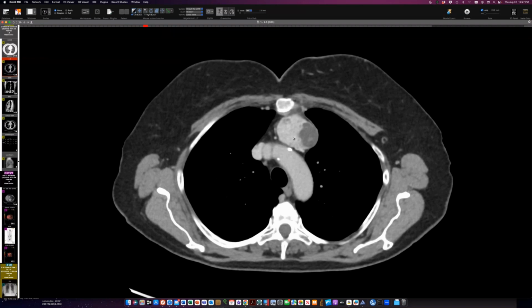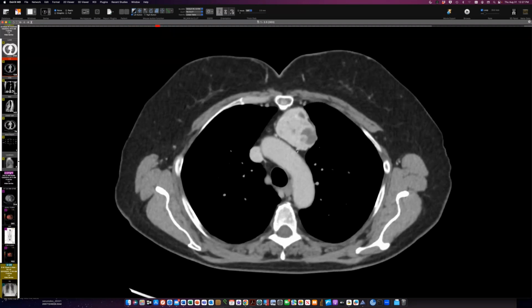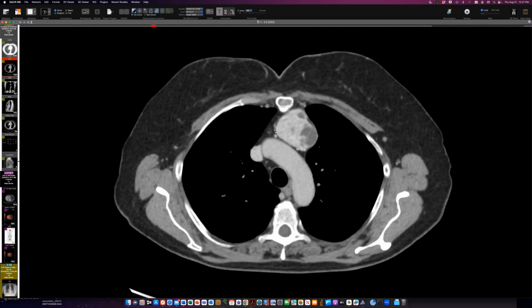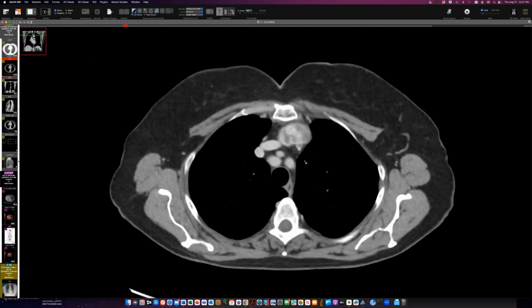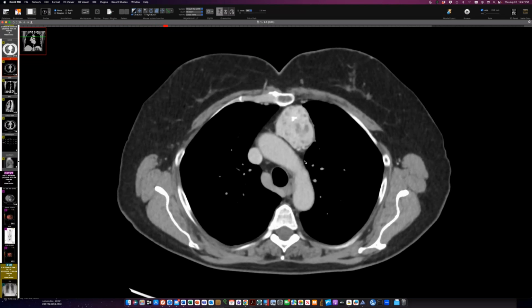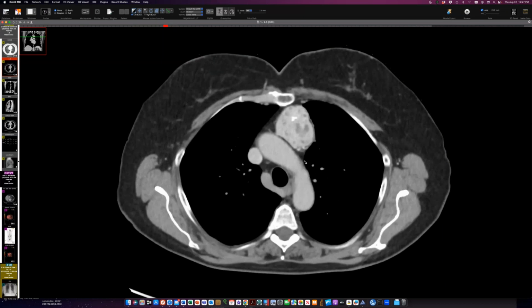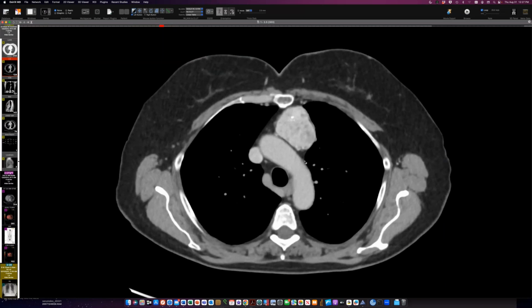And I think that the fact that it's vascular tissue is why we do see some hefty arteries. The paragangliomas I've seen have had even fatter vessels than this, though. So these are slightly dilated vessels, but not compared to what you can see in some cases of paraganglioma. So I think thyroid was a great idea, and ectopic thyroid, we don't see it that often, but here it is.